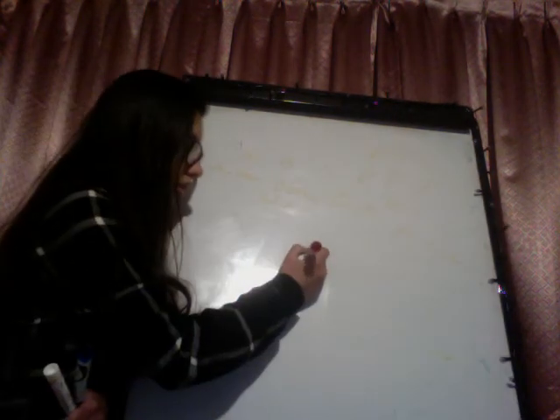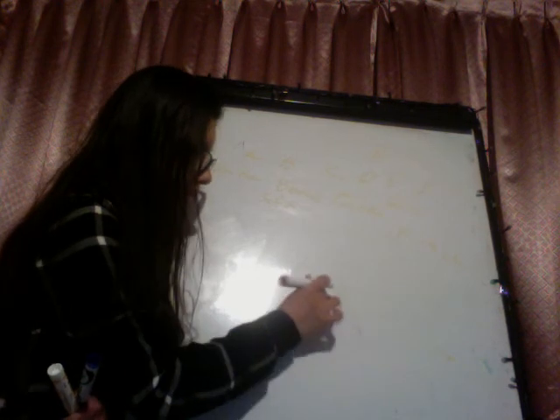Next, the cardiac silhouette. In the cardiac silhouette, we have here the heart, more or less like this. Alright, so first we have the aortic knob, which would be here. Here will be the aortic knob.